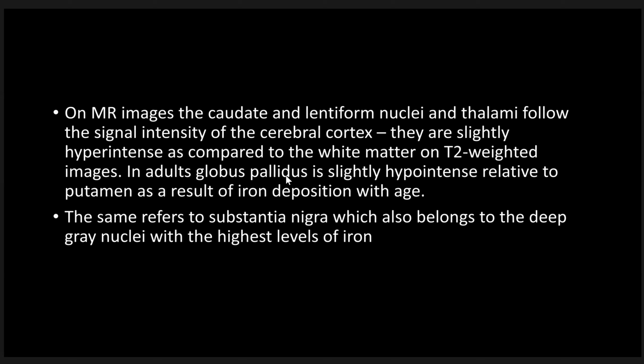In adults, the globus pallidus is slightly hypointense relative to the putamen as a result of deposition of iron, increasing with age. The same refers to the substantia nigra, which also belongs to the deep gray nuclei, with the highest level of iron.